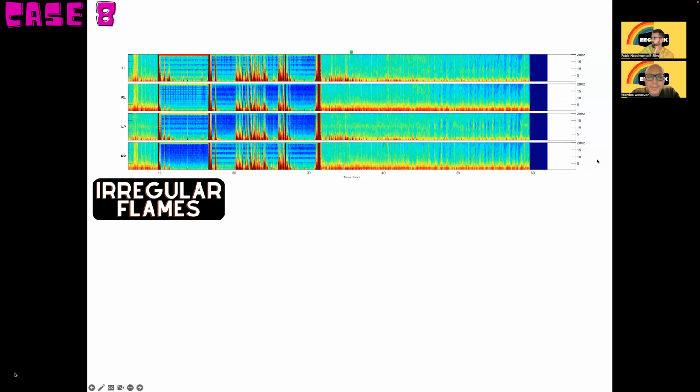Okay. And so this is another use for this, right? When you're unsure if the patient is connected or not, and you're starting to look at EEGs, look at the spectrogram to help out, right? You can find the parts that are probably just artifact. Cool. Then how about the pattern outside of the artifact part?